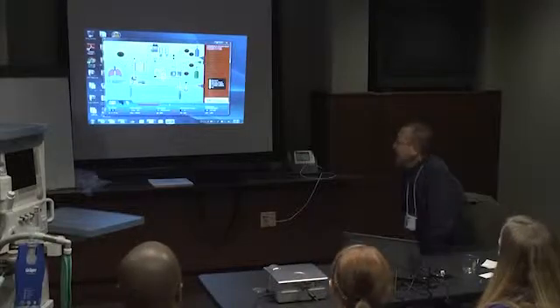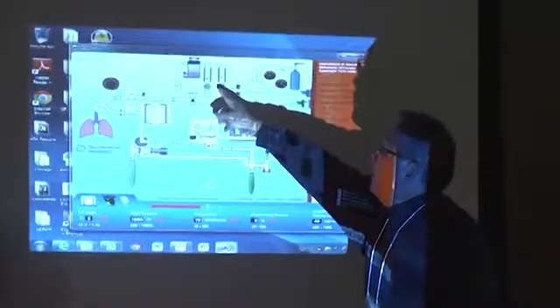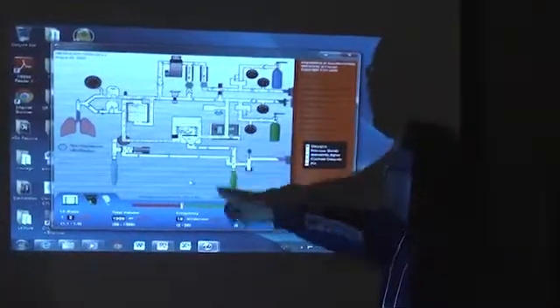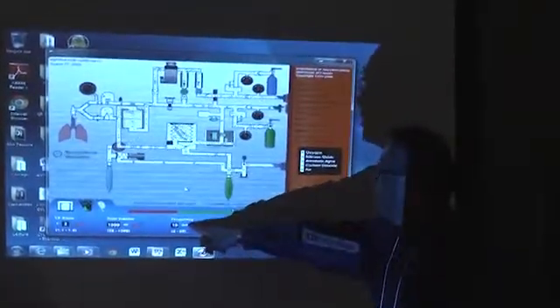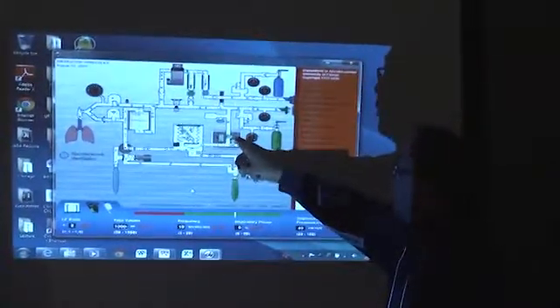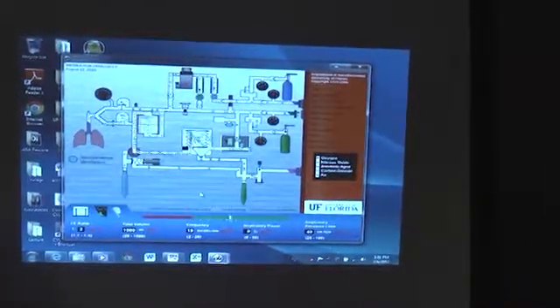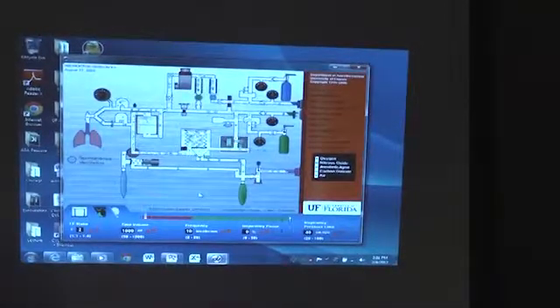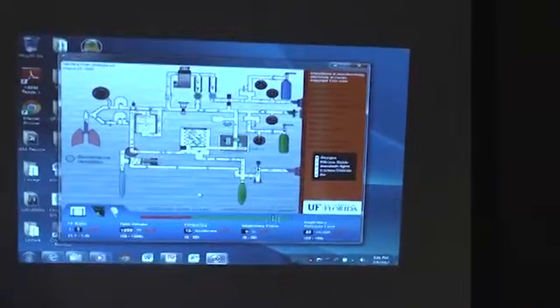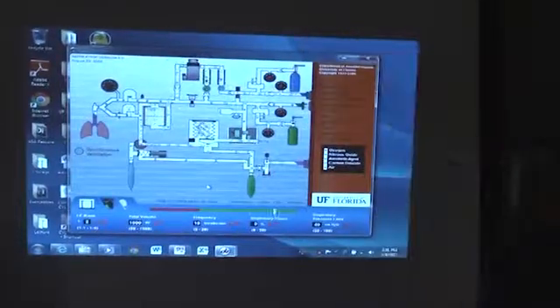It's driving the ventilator. Very good. Because if you follow the path here, the gas coming out of the cylinder, some is going to the flow meter, the 3 liters per minute, but there's much more actually going to the bellows. And you are actually controlling that. When you set your frequency at 10 per minute, you're actually saying every minute, 10 times a minute, I want this valve to open and let a bolus of high pressure oxygen go into the ventilator to squeeze the bellows. Just like, it's as if you have a pneumatic hand squeezing the bellows instead of the bag. And what is the bolus you would give? You would give the bolus equal to your tidal volume.